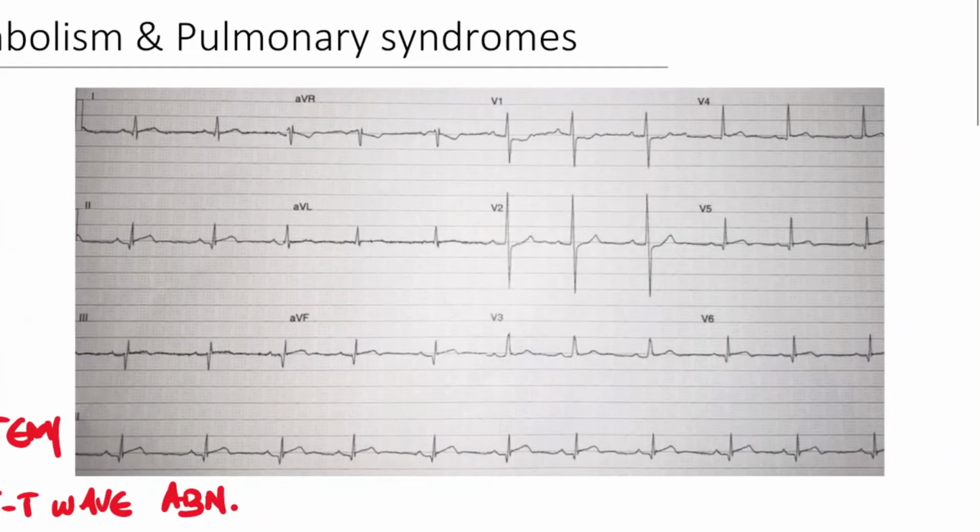You can also get increased QTc interval because the inflamed myocardium is going to damage the depolarization and repolarization. It can also cause increased QRS duration as well. Let's take a look at this ECG.